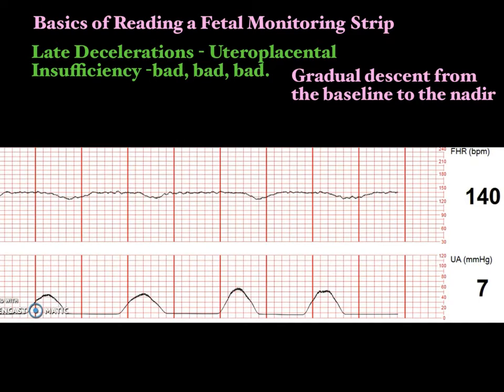And if you have a gradual descent from the baseline, and it's related to a contraction, it begins somewhere in the middle of that contraction, that is a late deceleration, and you need to know that that is a sign that the baby is not getting oxygen. Very often accompanied by minimal or absent variability. This is one that you want to resuscitate, okay?